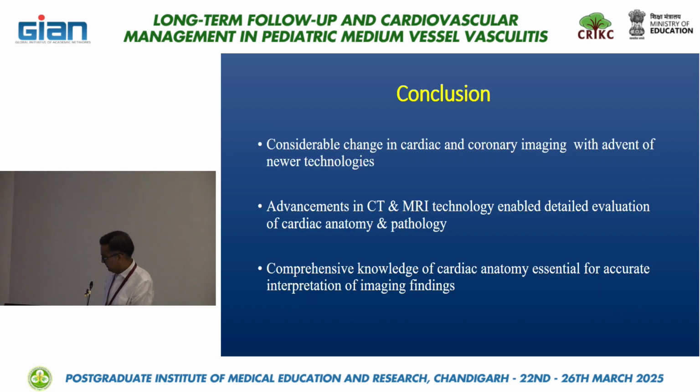So to conclude, with the advent of this technology, there is considerable change in coronary and cardiac imaging, and these advancements have enabled detailed evaluation of the anatomy and pathology of coronaries. The knowledge of anatomy is important for accurate interpretation of these imaging findings and to avoid missing any abnormality. Thank you.